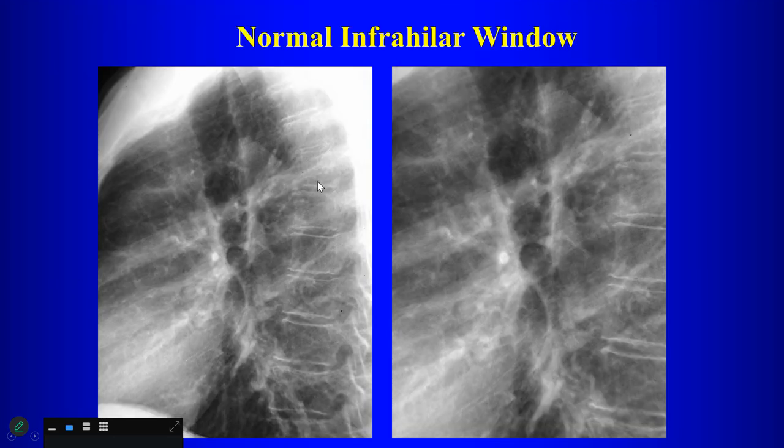Okay? So we've talked about the infrahilar window before. This lucency here is what?